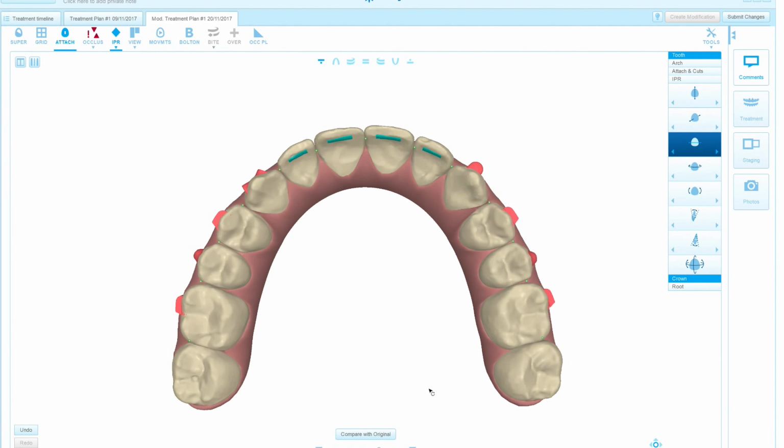I hope this part of the aligner is going to be clear, and now you can copy these attachments that I have used in this case and apply that to your cases in order to start having better results.